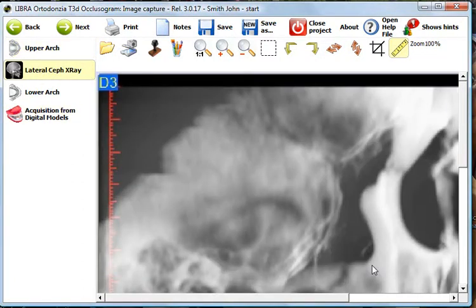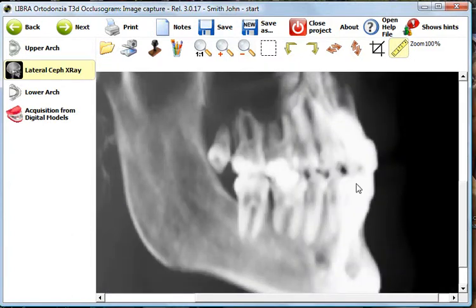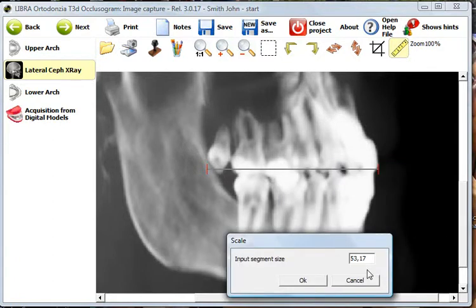So I go to the lateral cephalometric, which now has been resampled, so probably we won't see a big difference. And I go from this point to this point. And what I would say is that we have some error with this procedure. You can see that we have a couple of millimeters of error, sometimes less than this. But this procedure is accurate enough for our purposes.